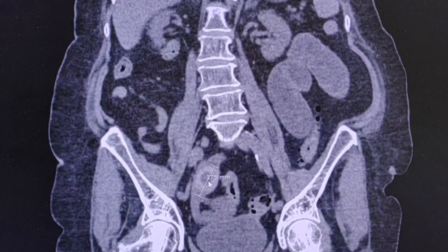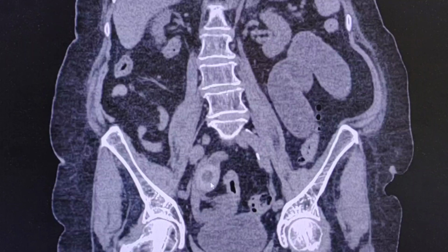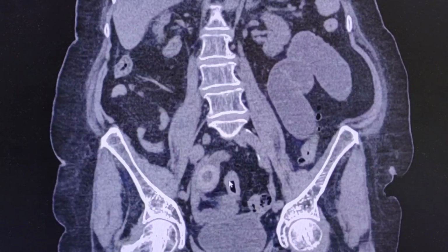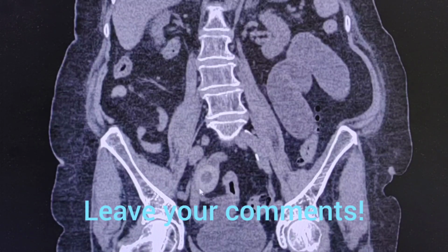So a stone may travel from the gallbladder into the bowel and become lodged almost anywhere along the gastrointestinal tract. Here in this case, in this region, traditionally we call this condition gallstone ileus. However, this is a misnomer because an ileus is by definition a non-mechanical bowel motility failure. But in this case we have a mechanical obstruction by this gallstone.